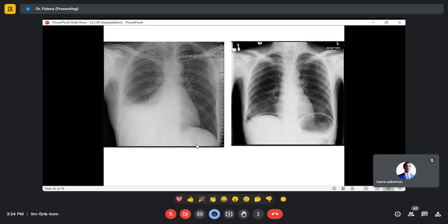The apex of the lung has some heterogeneous opacities. Exactly, that's very good. There are some opacities here. I think this is pneumonia, by the way, because it's an alveolar opacity with air bronchograms. So I think this is a consolidation. It may even be the cause of this pleural effusion, because if it is pneumonia, it's inflammation, it's infection, it can even cause a reactive pleural effusion on the right side.